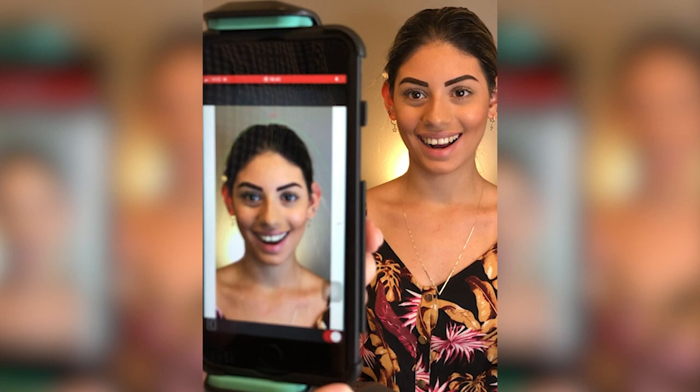In order for you to take the picture of your patient, make sure that you have good lighting and a solid background, such as a black or white wall. With your patient standing up straight, with no hat or glasses on, and hair tucked behind the ears, take a portrait picture with a natural head position. Level the lens of the camera to the eyes of the patient and make sure that your phone is straight. Looking at the lens of the camera, ask your patient to give a big, wide smile with the mouth slightly open. The quality of the picture will be relevant to the results generated by the AI technology.